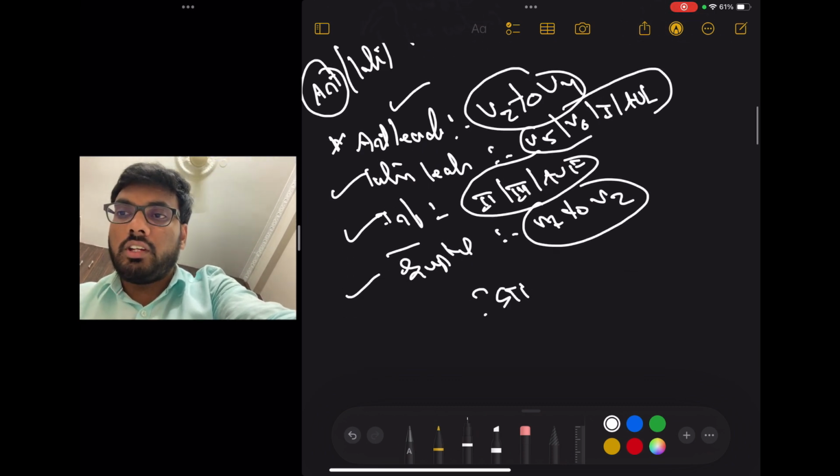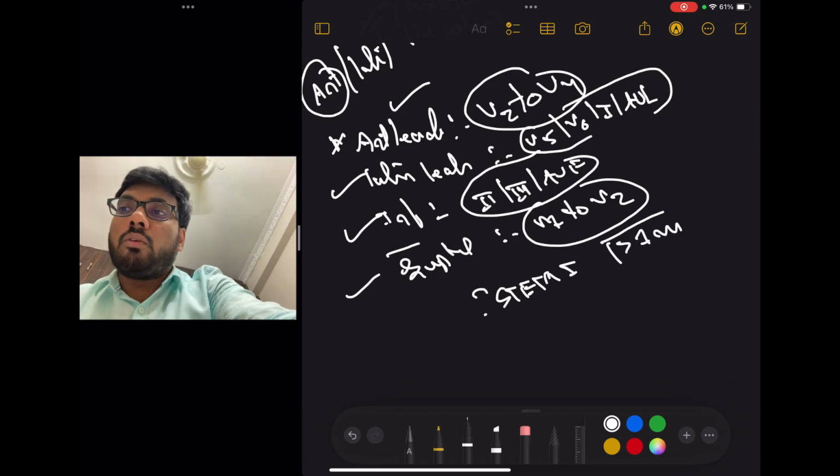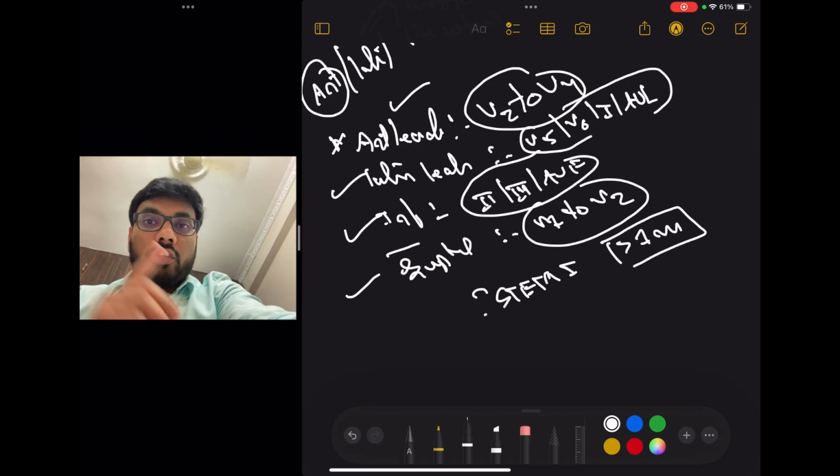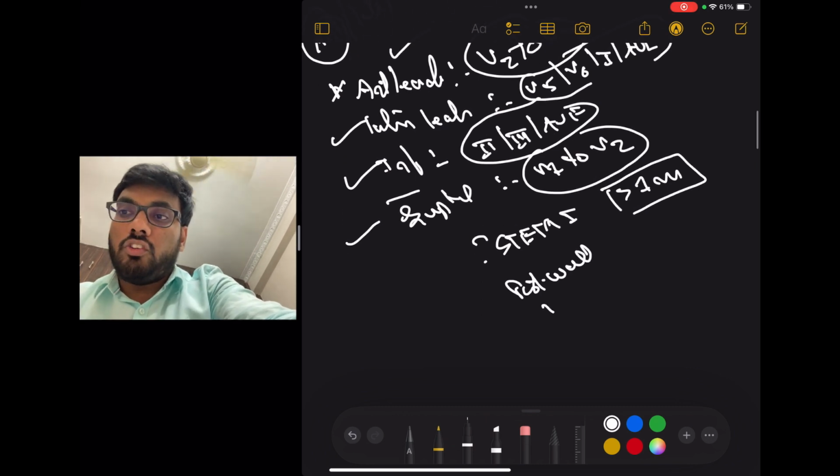Okay. How much ST elevation is required, by the way, for STEMI? At least 1 mm is required to call it an ST elevation, more than 1 mm. The exception is posterior wall STEMI.